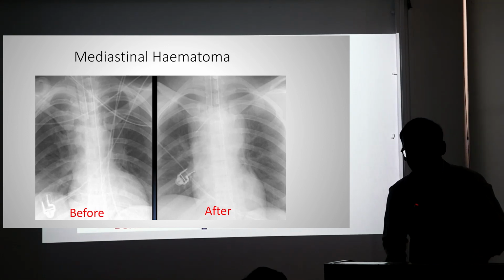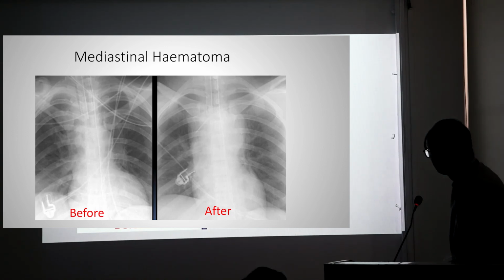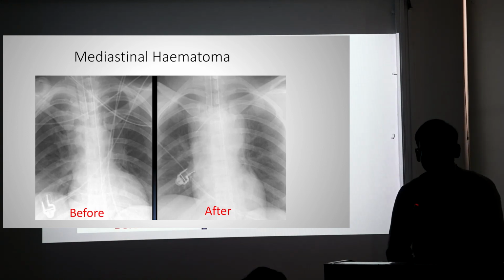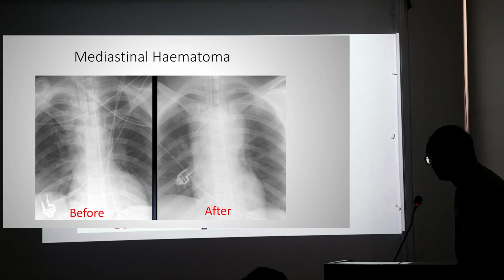So can anyone volunteer what has happened over here? This is the before central line and the after central line. The X-ray done 1 hour after the central line done from the left side.